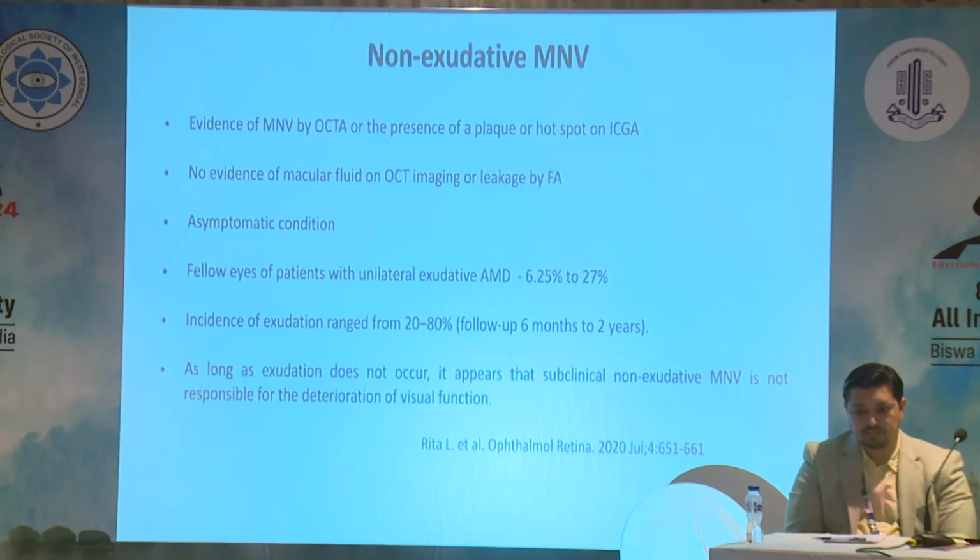Also, if ICG is not there, we have OCT and OCTA, which give us very high sensitivity and specificity, and based on our clinical findings, we can make a diagnosis of PCV and treat the patient accordingly. So now I'll come to the second part, that is the non-exudative MNV.